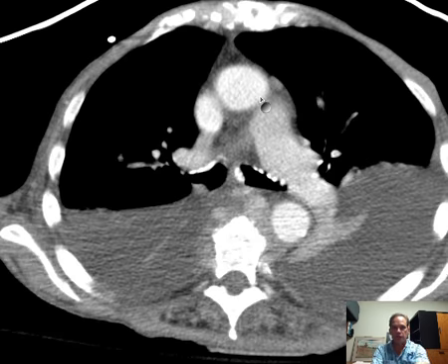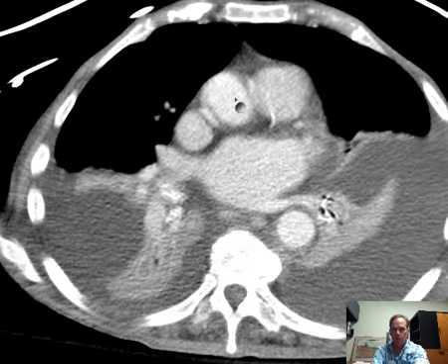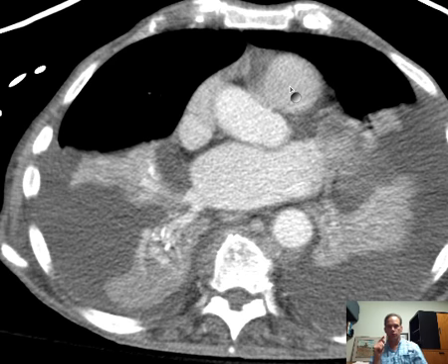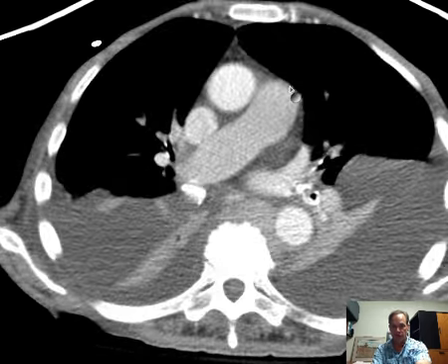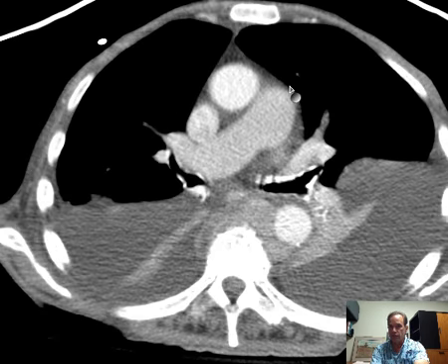Okay, so you'll see that in another plane, and I think that'll illustrate it a little more clearly. Let's look back where these two are coming from. Where are they coming from? Well, you should be able to just think: pulmonary artery is what? Is it oxygenated blood or deoxygenated blood? And where is it going? Well, it is, of course, deoxygenated blood, and it is going to the lungs. So pulmonary arteries go to the lungs, and they go there because they are carrying blood that requires oxygenation.